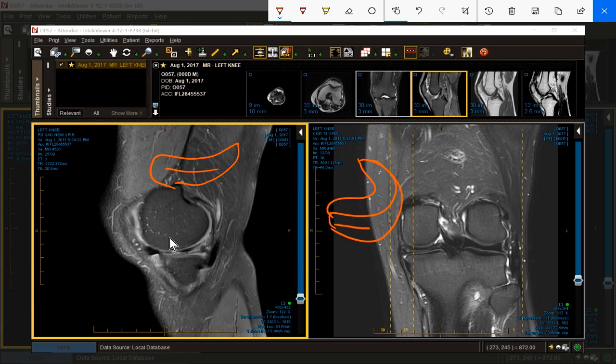Whereas a flap tear is like a radial tear. It'll come in from here, and then it'll start to curve and dive down. So it'll dive from superior to inferior. It'll oblique its way through the ligament. If you look at it from the side, it may look something like this. It may hit the bottom and come back up, or it could start over here, hit the bottom and then come back up. And that's what this tear has done. It's come down. It's dove in two directions.